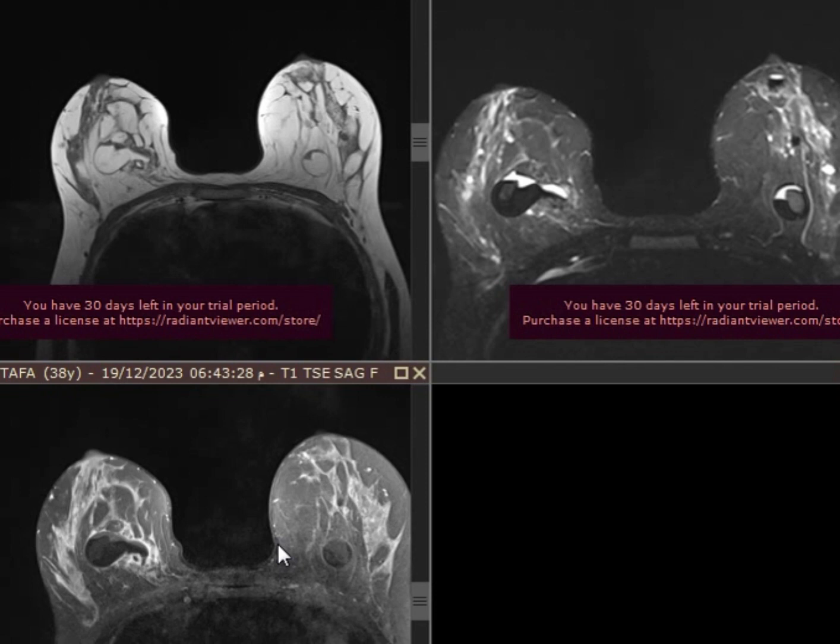Fibroadenoma. Does fibroadenoma show fat signal intensity? Fibroadenoma, does it have fat? No. It's an adenoma, it's a cell, not fat. I mean, soft tissue first. What else?